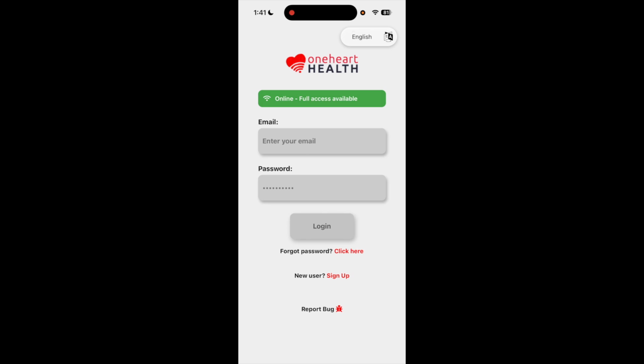I am the Executive Director, and I will be walking you through how to create an account, how to add a patient, record heart sounds, assign patients, complete assignments, review consultation details, and then a brief walkthrough of some of the updates in our settings and language features.